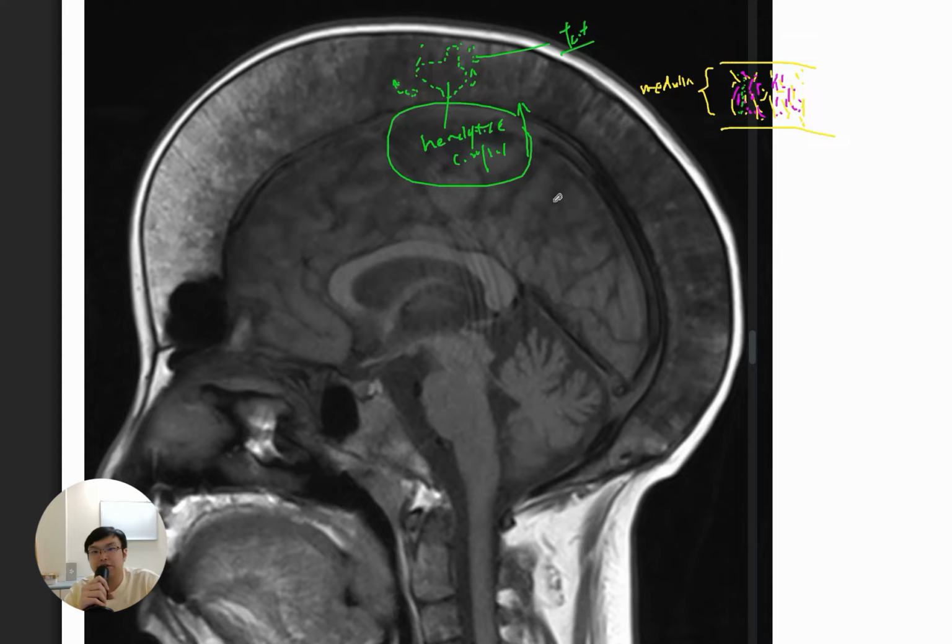So you will expect that everything, especially the hematopoietic component, will be hyperplastic and will expand the bone. But this is just the superficial portion of the story. What is more important is that whenever they expand, the trabeculae that we have just mentioned, the yellow ones, come in two types. One is called primary trabeculae, and another one is secondary trabeculae.